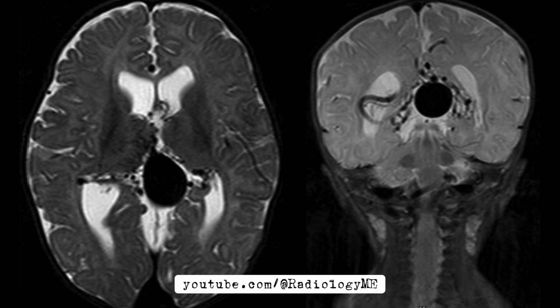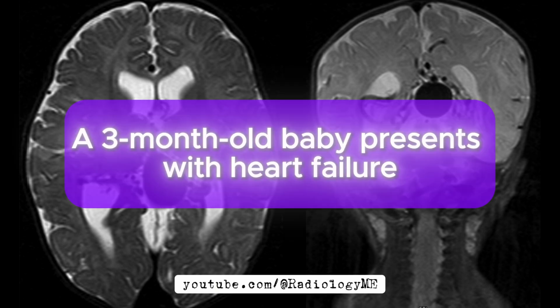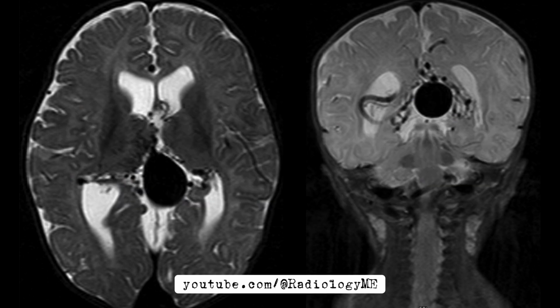All right, so let's dive into this case together. We have a 3-month-old baby presenting with heart failure, and an MRI has been performed to get a closer look at what's going on. Heart failure in a baby this young is always a red flag, and you know it's time to be on the lookout for something significant, particularly involving both the heart and the brain, given how intricately they're connected.